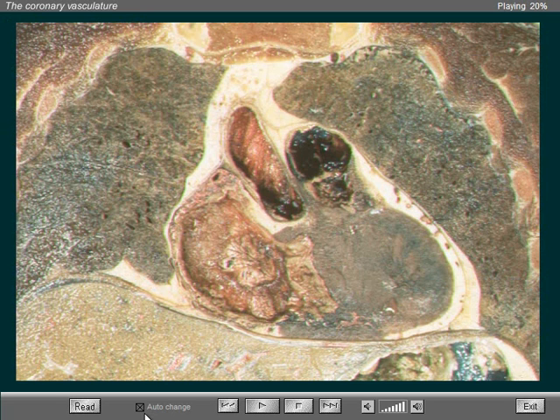Note in these four images, the first one, a coronal section close to the sternum, the envelope of the pericardium, surrounded by epicardial fat medially and mediastinal fat laterally. Note that some branches of the coronary arteries and veins are seen in the epicardial fat around the left ventricle.